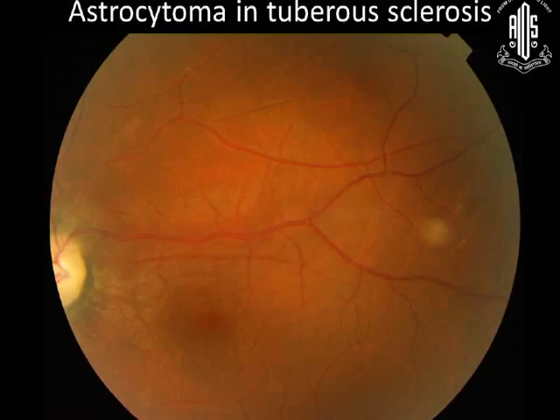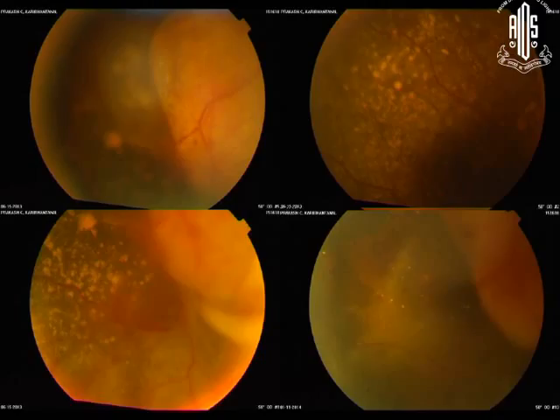And astrocytoma usually is a small lesion in the periphery, or it can present like a mulberry lesion at the optic nerve head. So what is this? This is again a very rare form of astrocytoma called giant astrocytoma. This can present with an exudative retinal detachment.